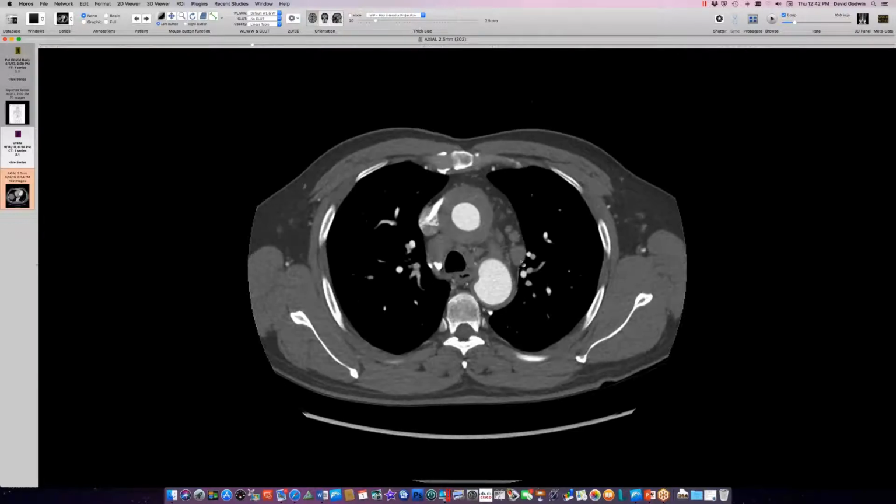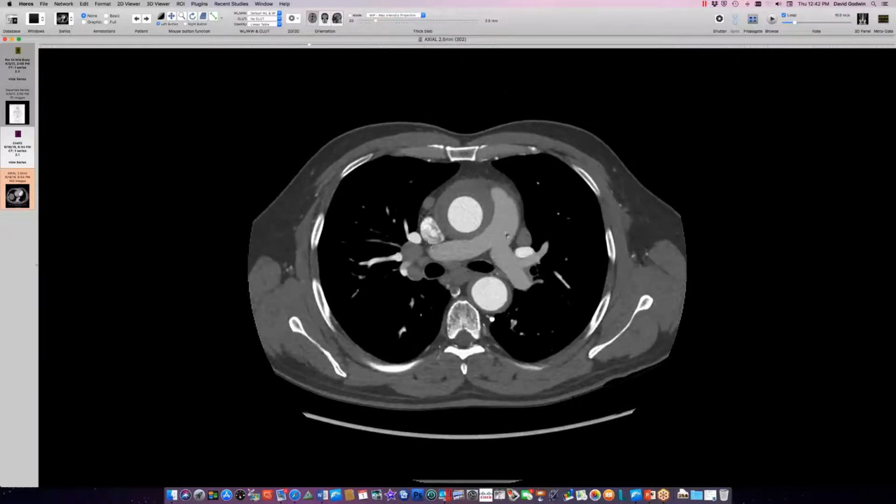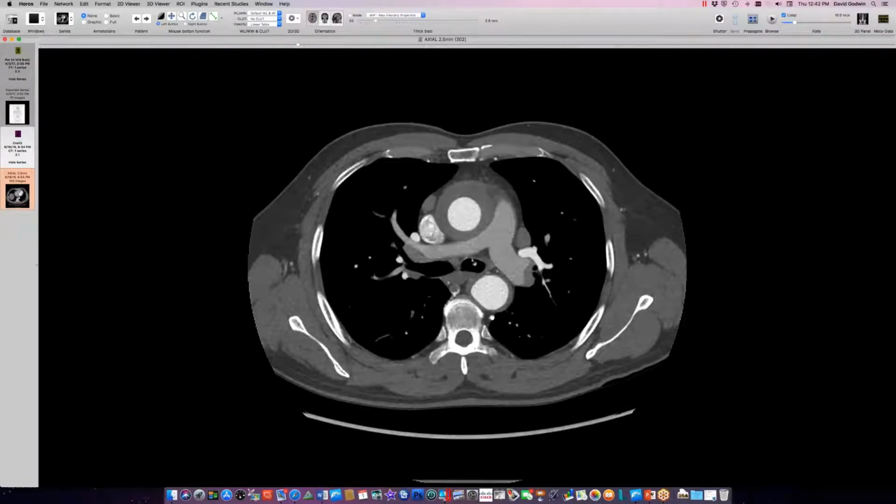a sarcoid pattern of lymphadenopathy. I did find a case report of sarcoid-induced aortitis, and that's what I thought the best candidate was to explain both the lymphadenopathy here and this aortitis in this guy. So he had a long workup over months, and nothing really fit very well. One of the considerations was Cogan syndrome, which I hadn't heard of before, which involves eyes and ears, and it's a kind of rheumatologic condition, and then can also have an aortitis.